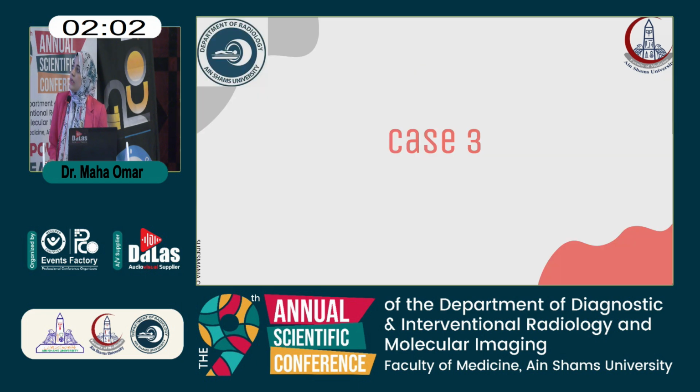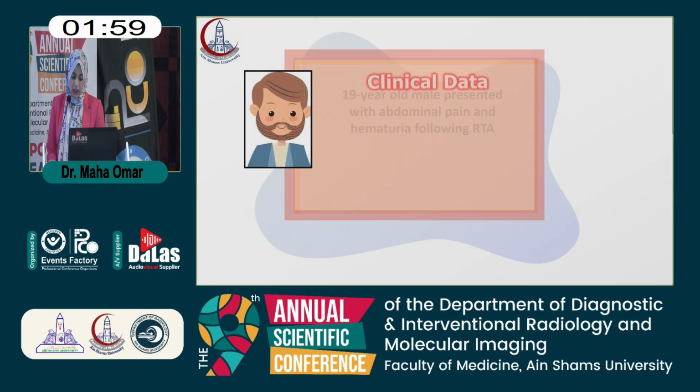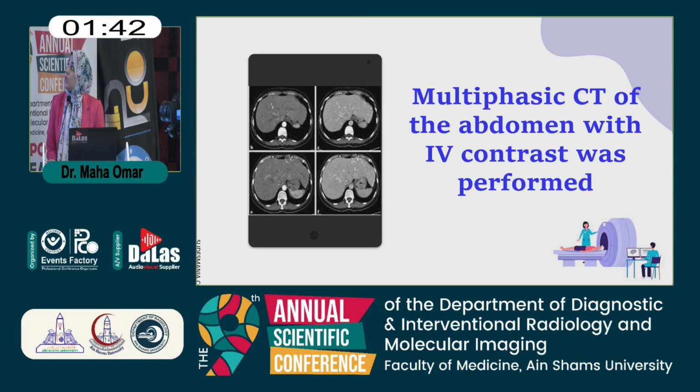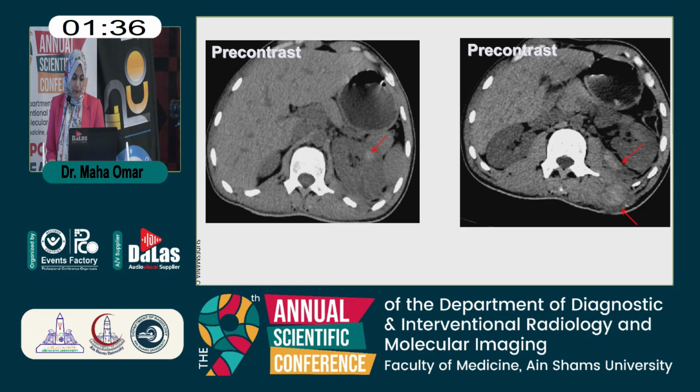Okay, case number 3, it will be quick, highlighting important points for junior radiologists, especially in the emergency setting. The patient is a 19-year-old male, presented with abdominal pain and hematuria following a road traffic accident. Multiphasic CT of the abdomen and pelvis with IV contrast was performed.